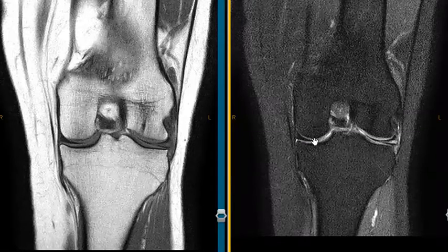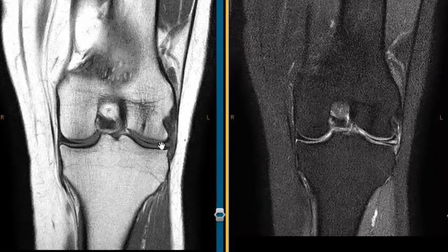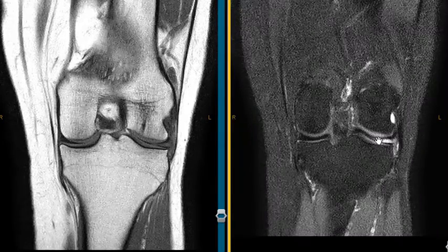This medial meniscus looks pristine, but the lateral meniscus does not. There's a horizontal band of brightness right within the meniscus. On this one we call it a T1 weighted view, where subcutaneous fat is bright, marrow is bright. On this view the signal is more intermediate signal, but we can see that this is abnormal and the medial meniscus is normal. Again, the medial meniscus is normal, the lateral meniscus is abnormal.